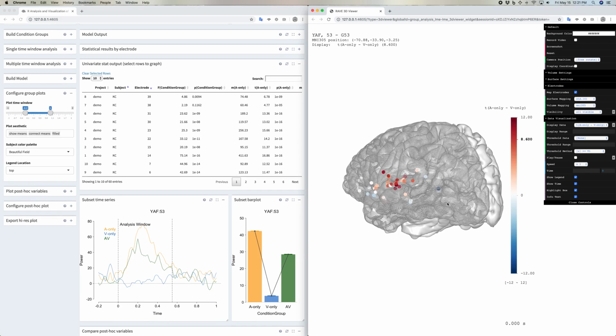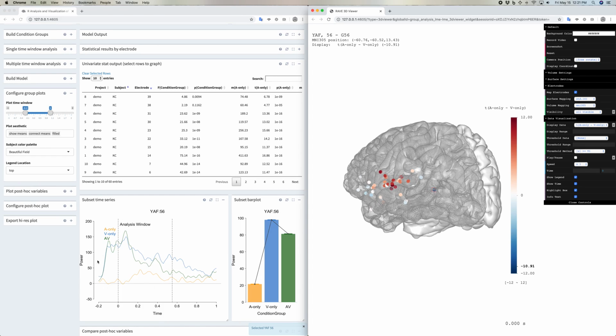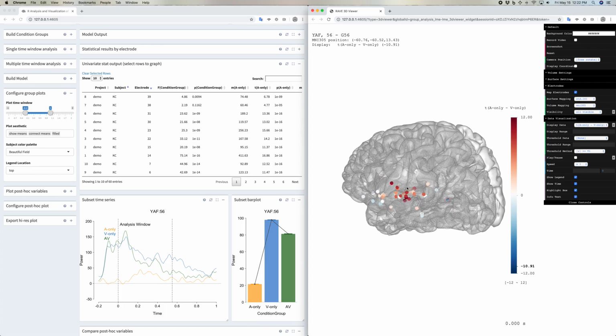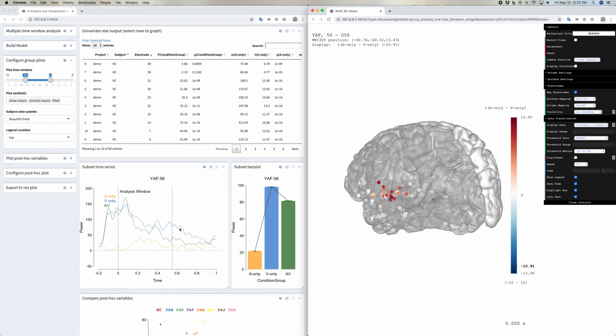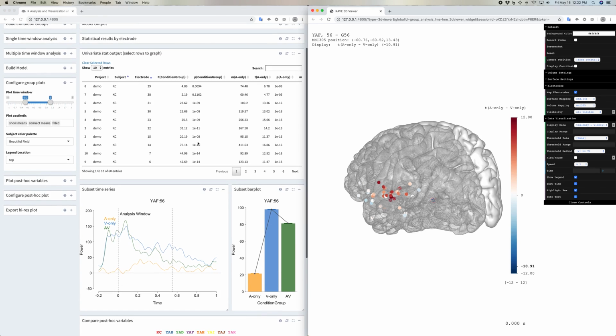And so you can find there's one electrode there that actually likes V only better than A. I don't know if that's a depth electrode or just badly localized electrode, but actually shows this V greater than AV pattern and an onset that's more similar with visual onset rather than auditory onset.